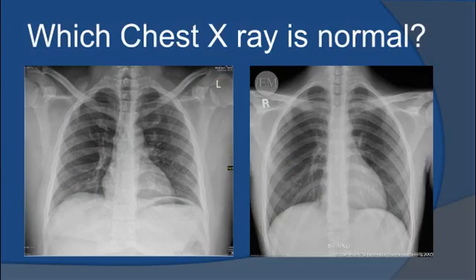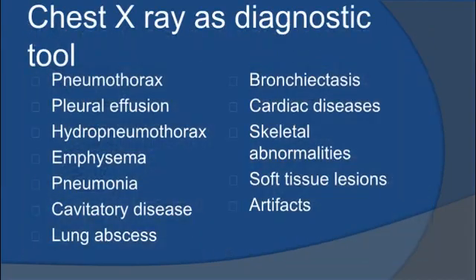Can you tell which chest X-ray is normal? The left or the right one? Kindly mention in the comments below. Chest X-ray can be used in diagnosis of a variety of conditions as enumerated over here.